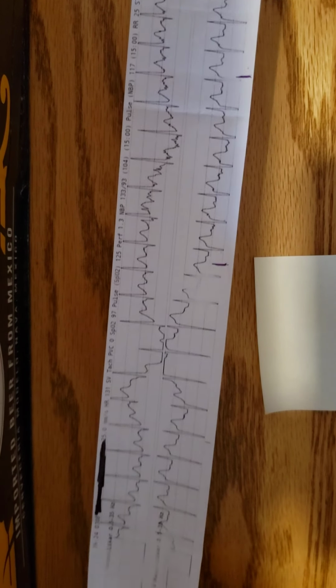The reason it kind of waves up and down, that's just the patient moving in their bed. They may have coughed. That's just repositioning. Remember, I told you it really depends on where the leads are as to where you see things. So that's the deal with that.